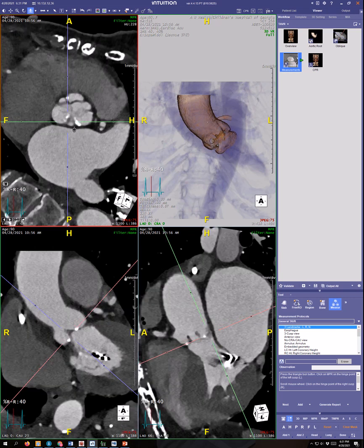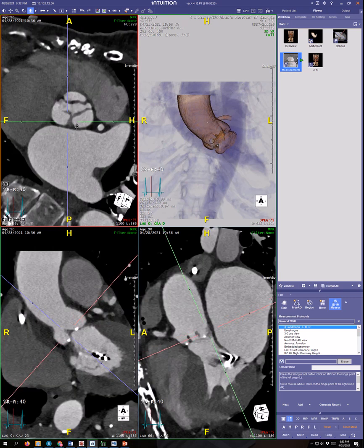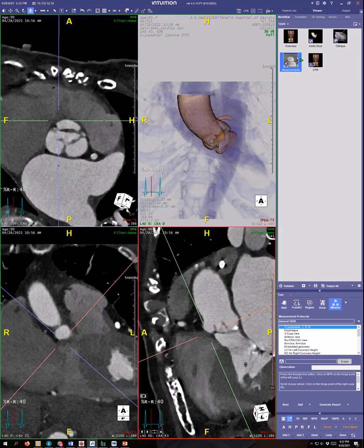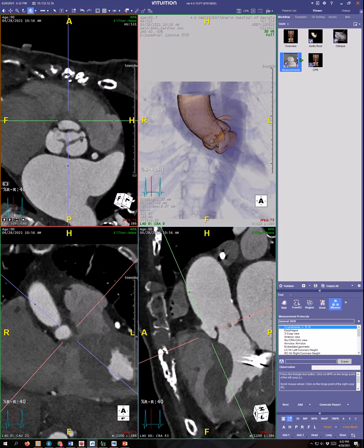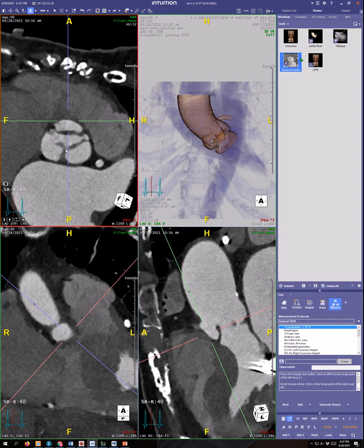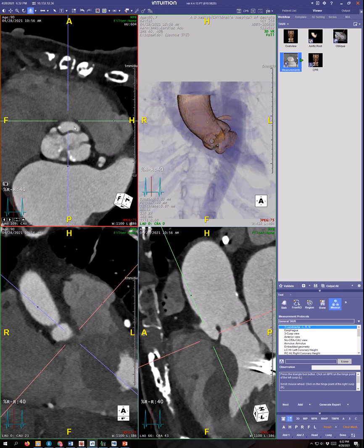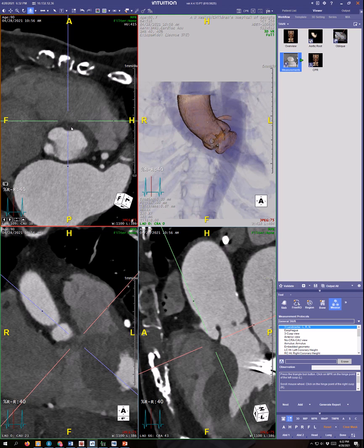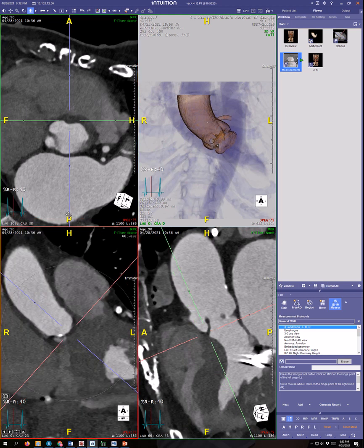Let's hone in on this. There's a MitraClip already. So what I did is a double oblique, turning the crosshairs counterclockwise by hovering over these little dots in the what are now pseudocoronal and pseudo-sagittal planes to approximate a cross-section through the aortic root. Now I'm just rolling the wheel down to find the nadir of the attachment of the right leaflet, the so-called hinge point. There it is.